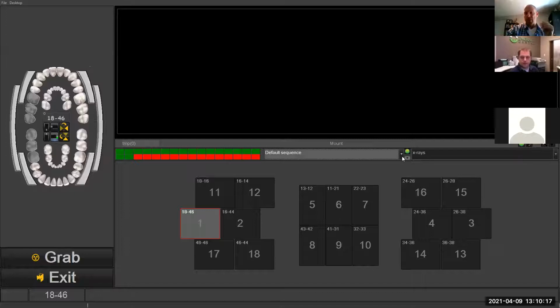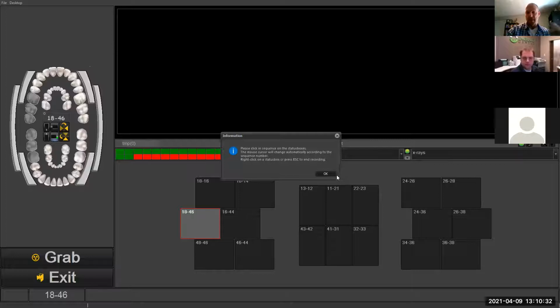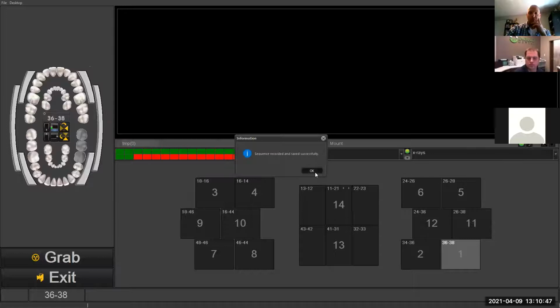So let's say you wanted to create your own. We have add a record or sequence. Let's say Kathy likes to do it one way. We can then put in any type of name. It says, please put in your sequence and hit escape on the keyboard. So if Kathy likes to start here, and then she likes to do this one and this one and then this one, and then finish with these bite wings, and then does, I don't know, 2 periapicals, done. So now it's programmed and the sequence will be followed, and the computer will automate everything, okay?